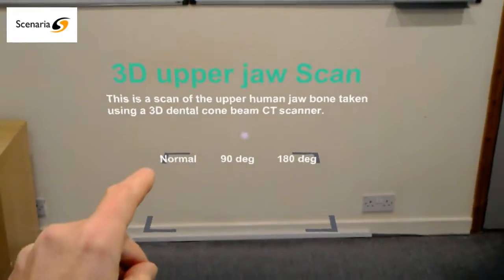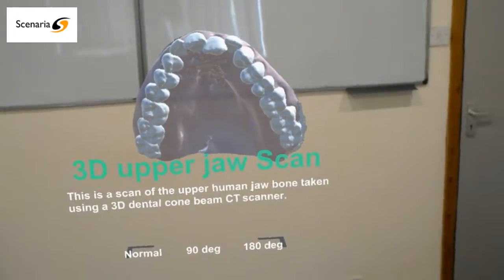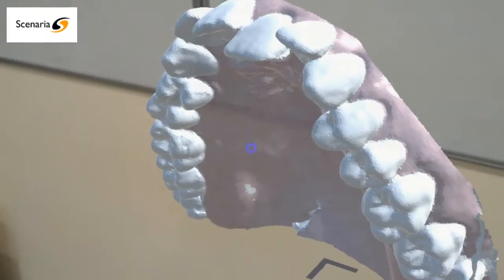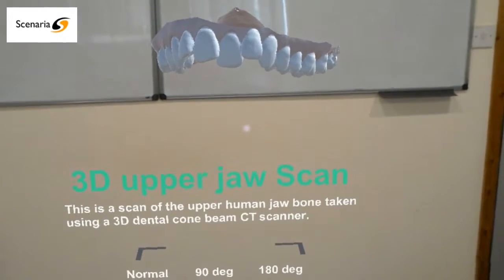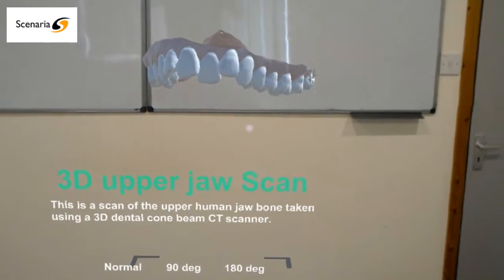So if I now flip the orientation to 90 degrees, you can see there that the teeth have been moved, so you get to see underneath. So I'll just flip that back to normal. So this hasn't resulted in any recompilation of any code.